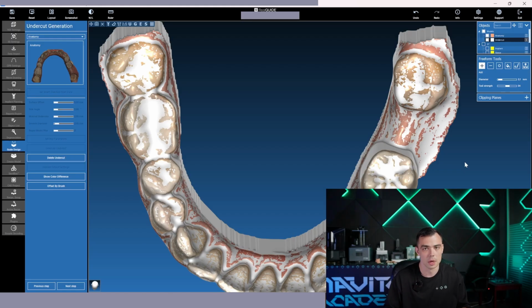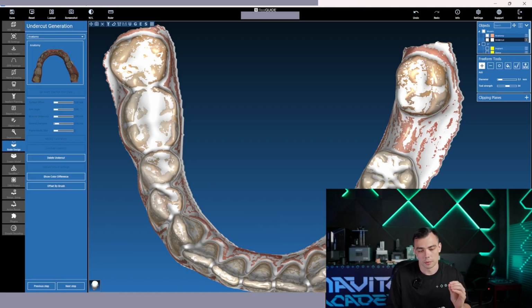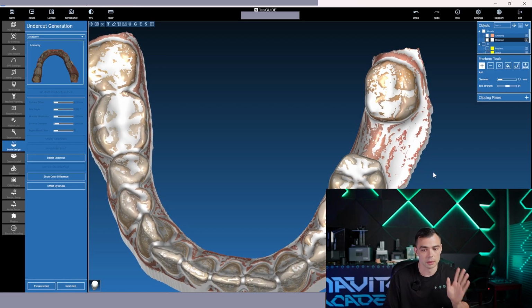And if you see during the operation that your guide is rocking, is bouncing, most probably, 99%, there is a problem with the scans, or there is a problem with the plaster model and so on. So if you see such dangerous areas, just slightly add some volume. It will not spoil the fitting of the guide itself, but it will make some kind of safety zone for the perfect guide fitness.